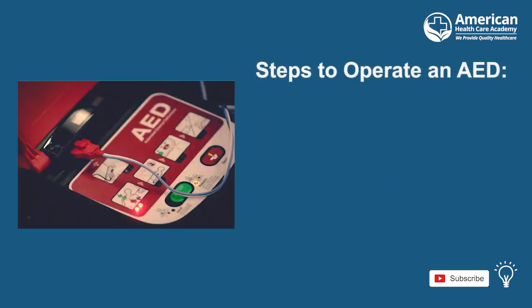Let's go over the steps to correctly operate an AED, which are often found in many public places. There are different models and manufacturers of AEDs, but most of them can be used simply enough by taking the following steps. Step 1. Turn on the AED.